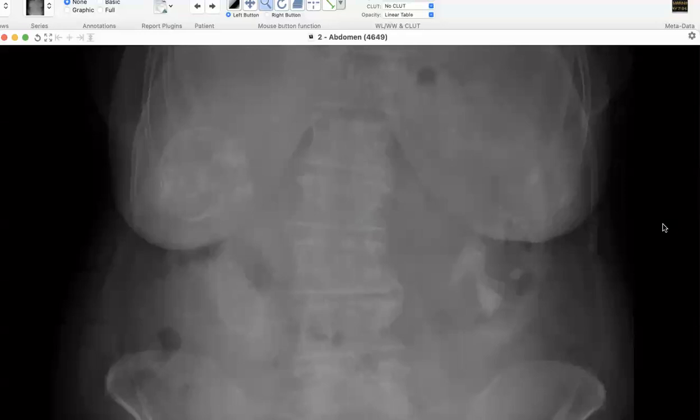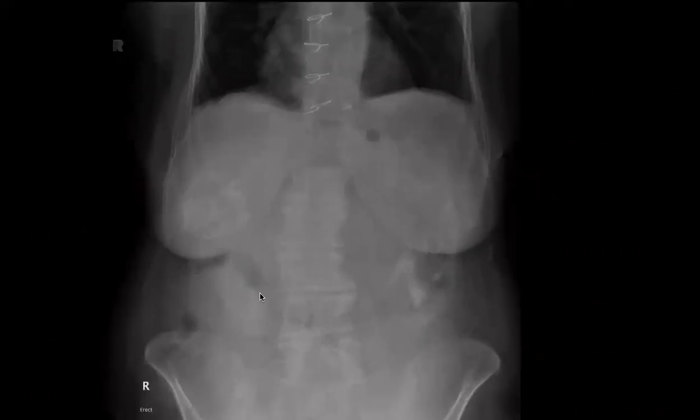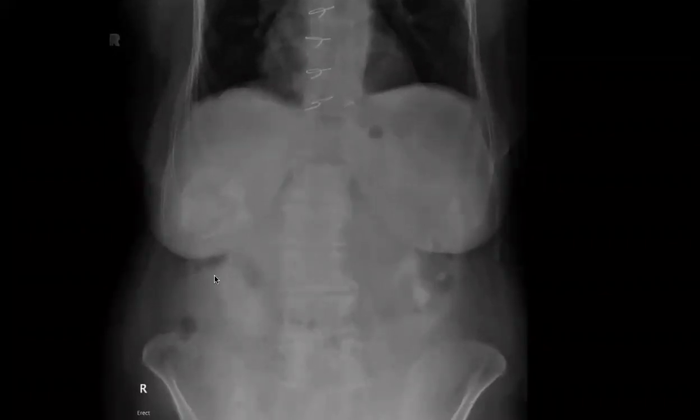You can take the mouse. Just show me what you're talking about. I saw one here. Just click and point. Click and move the mouse. Can you see my mouse? Yeah. So surrounding the right hypochondrium, there are multiple calcified lesions on this side. It could be spleen or even in the kidney. And maybe here, because it's not clear, there are some calcifications or it is bowel. So multiple calcified lesions, specifically in the liver and the left, supposed to be kidney.